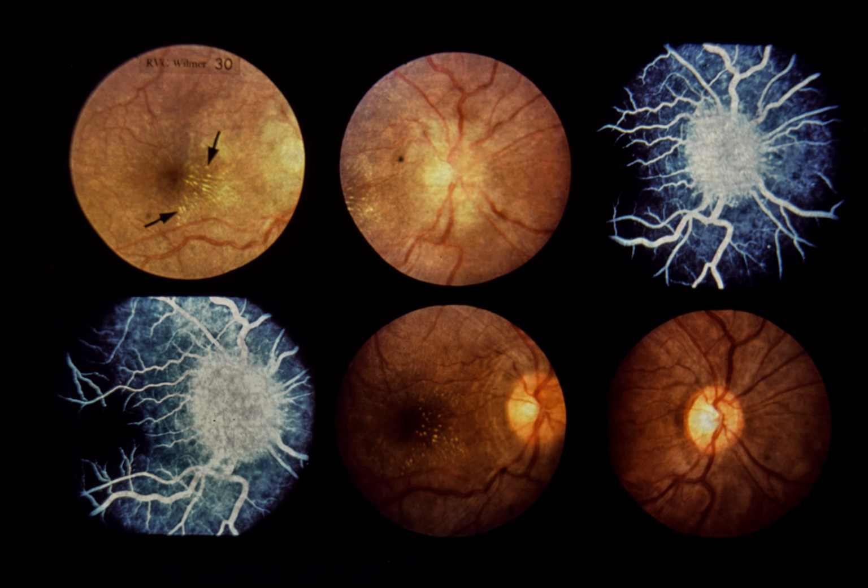This patient represents a syndrome of anterior optic neuritis with macular star formation. This syndrome has been called Leber's stellate maculopathy because the macular star figure is especially prominent, and the associated optic disc edema often resolves before the patient sees an ophthalmologist.